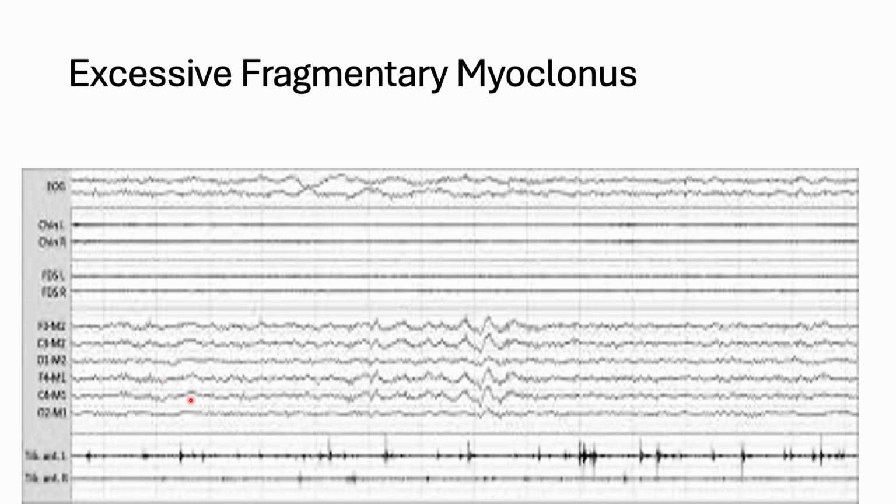All right, so we've got what looks like N2 here, and you can see these little blips showing up, mostly in the left leg. All these little things right there. Kind of looks like artifact. But these are little muscle cell activations. Sometimes you might hear the term spicules or fasciculations. Those just mean muscle cells are irritated and excited to the point of causing a little activation. This only occurs during sleep and does not really cause arousals. These don't count towards PLMS because they don't meet the duration requirement.